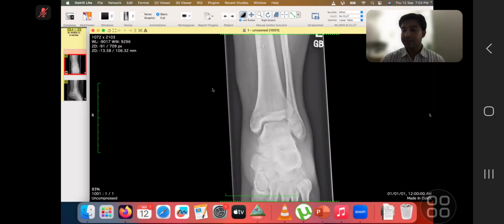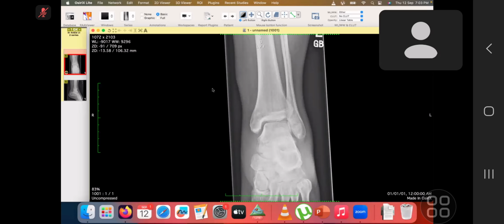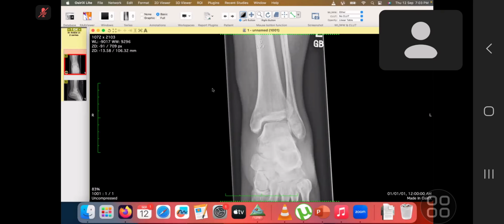Yeah, this is your next case. The patient has some swelling in the leg, erythema and swelling. Okay, so I'm presented with distal tibia fibula radiographs, ankle radiograph frontal projection in a skeletally mature patient who has presented with leg swelling and erythema.